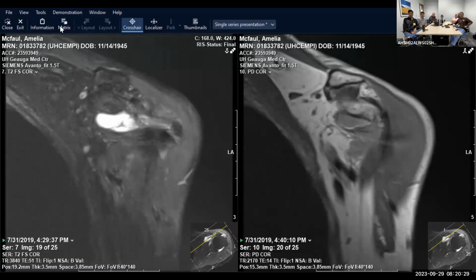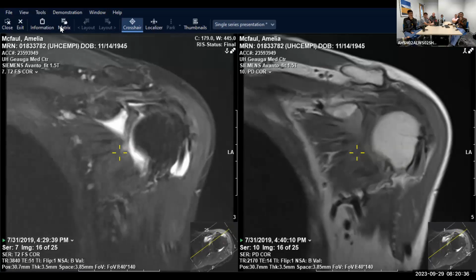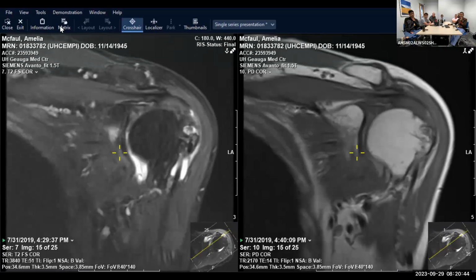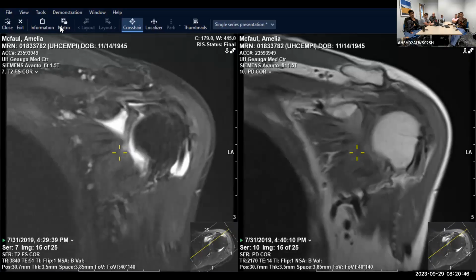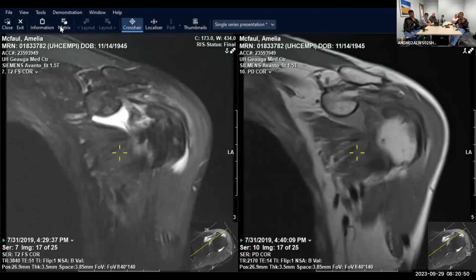Okay, so coracoid process we see here, and just beneath that, we see our multipinnate tendon of the subscapularis. Then we start to see long head biceps coming up and over the intertubercular sulcus and hopefully inserting on or originating the supraglenoid tubercle. The next slice you really want to pay attention to, when we see our long head biceps, it's here. The next slice, and you can even see part of it in this slice, is the leading edge of the supraspinatus.